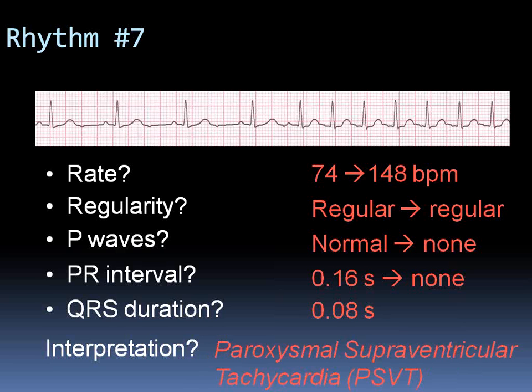You know, just look at how a flutter looks like, look at how a SVT looks like, look at how an AFib looks like, look at VT. So look at those rhythm strips, look at those EKGs. It is a lot to do with rhythm and pattern recognition also, and not just trying to break down every beat of QRS complexes that you see on the strip. Okay, it is a lot to do with rhythm recognition.